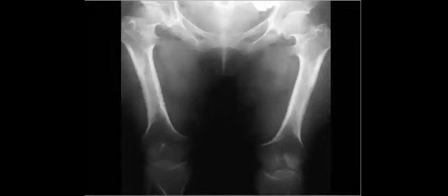You can consider this as metaphyseal flaring, bilateral here. And the bone affected is the femur. So this short tubular bone, rhizomelic dwarfism. This type of dwarfism is rhizomelic because it involves the femur, right?